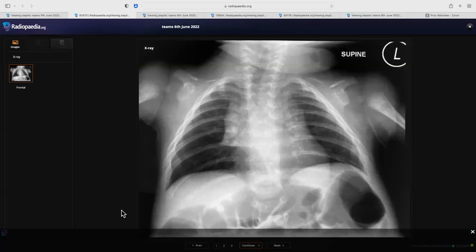I'm not sure of the cause of the pneumomediastinum, but I will discuss the sign of pneumomediastinum which you can see. I think there is some raised thymus, the sail sign. Okay, that, I can tell you that's a normal thymus, so you can ignore that. Right. Can you focus more on the bones? Bones, okay.